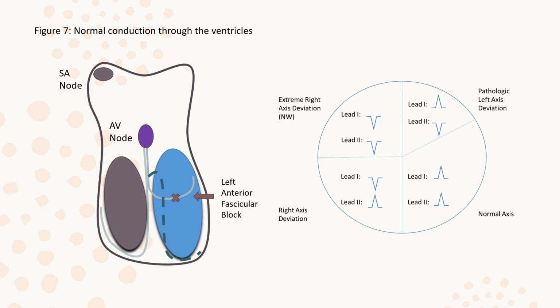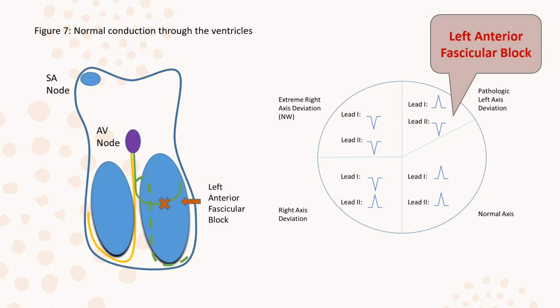Now, I have it right here. So it's just always and forever, whenever you have this left anterior fascicular block.